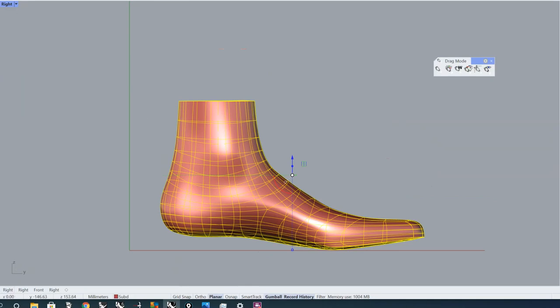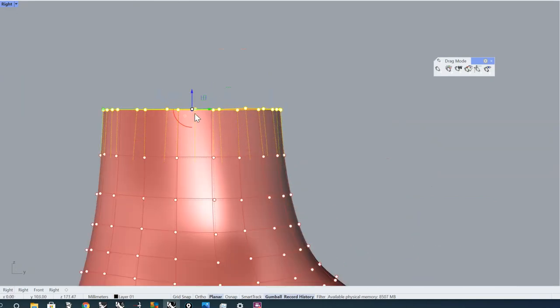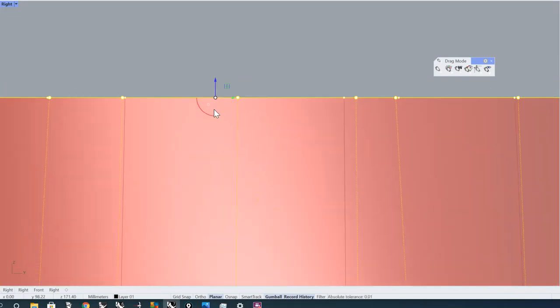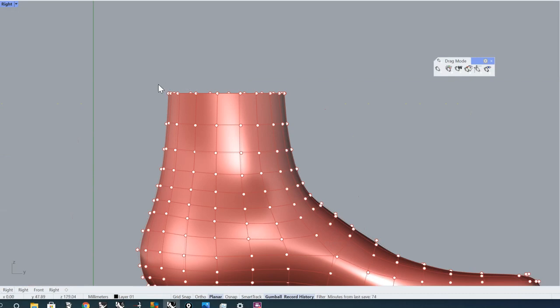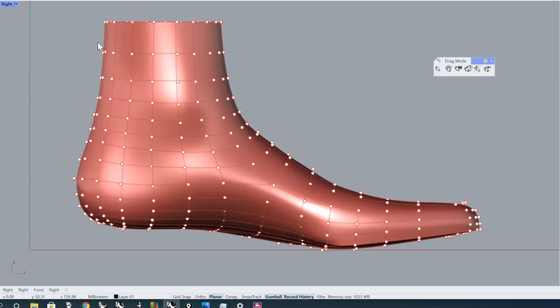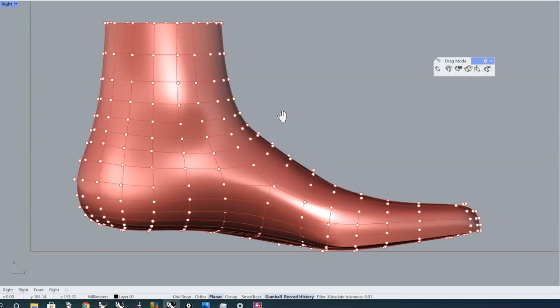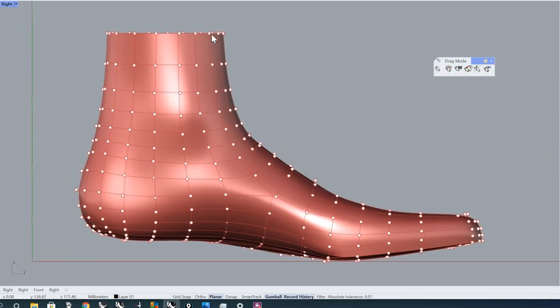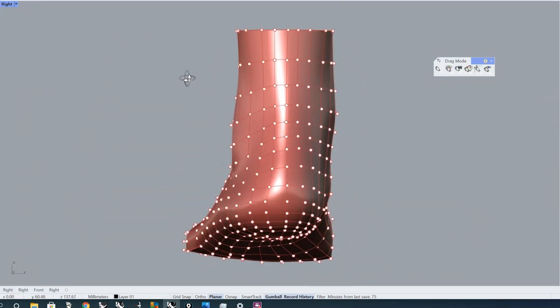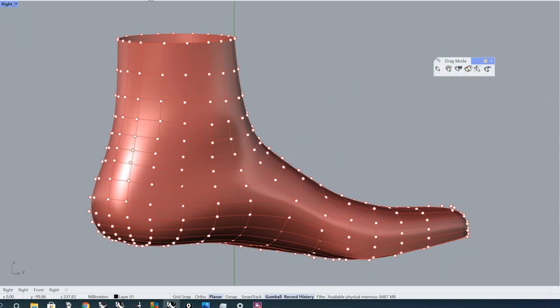First I have to make sure that it's exactly straight, planar. So, okay, now it's exactly planar. This is also easy when you're making an insole or a supplement, and you push material underneath the last and grind it in the right shape. You always have a reference of the top of the last. If you keep it horizontal, it's very easy to keep the position of the last as you want it.